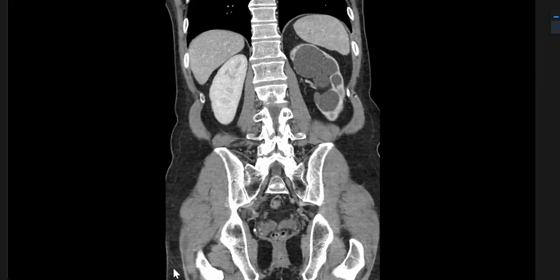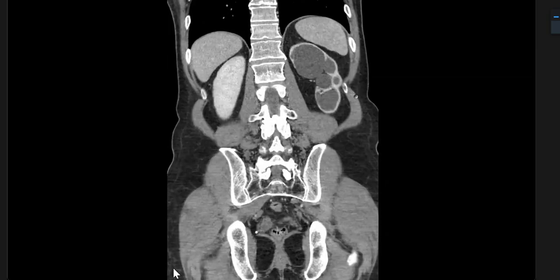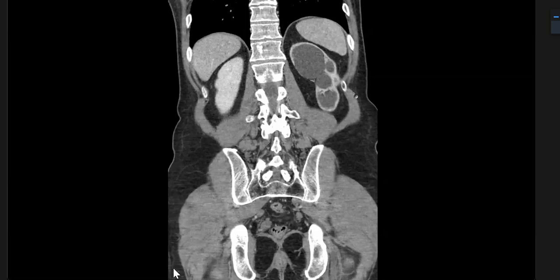Anything on CT scan you would like to do? We can take the Hounsfield density of this cyst as well as the hydronephrosis. Anything else? We can do the delayed images. Is this particular image telling a story? We see the communication. If there is no communication, that could be a cyst in the upper pole.